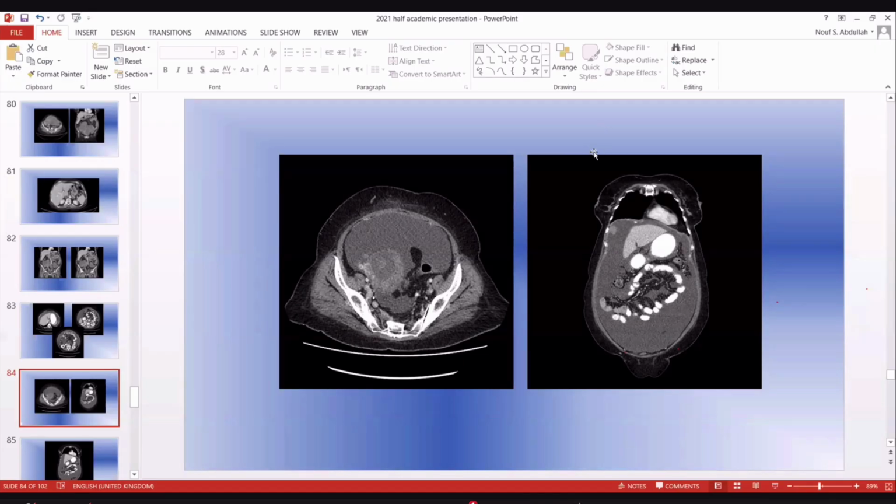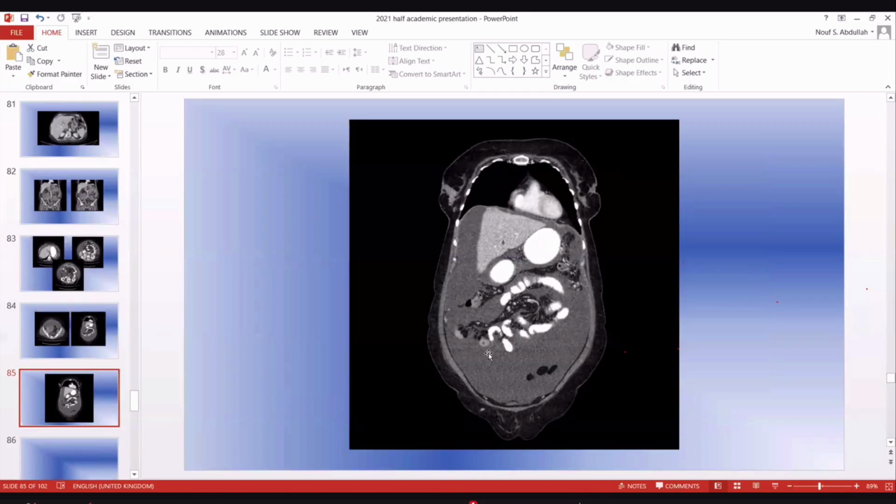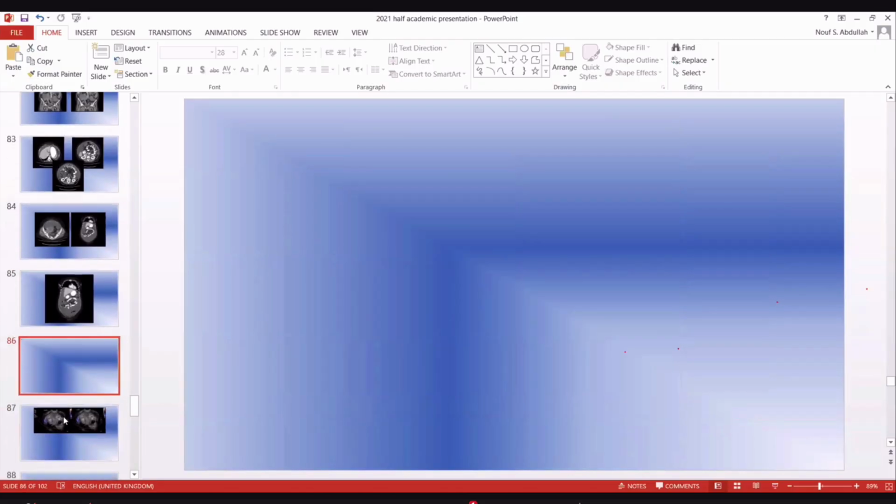gynae case. So whenever I am dealing with a solid or complex cystic lesion, or a uterine or cervical lesion, these are your important negatives. I will always talk about retroperitoneal lymph nodes, I will always talk about ascites, and I will always talk about peritoneal carcinomatosis, because at the end, this will give the final conclusion. In this case, you see ascites, and I would question that there might be something in the right breast. So if you have a complex cystic lesion, probably metastasis would go first.